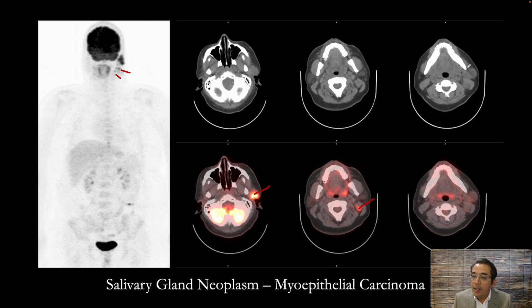And the interesting finding here is that more inferiorly there are these cystic or centrally necrotic lymph nodes that do not show hypermetabolism, as we see here on this fused PET-CT image. So remember, there are certain malignancies that lead to cystic or necrotic mets, and we may not find focal hypermetabolism, just like we see in the solid organs with cystic or necrotic mets. There may be some mild peripheral FDG uptake, but centrally there is usually no FDG uptake. So remember to look at anatomic findings on the CT in such patients.